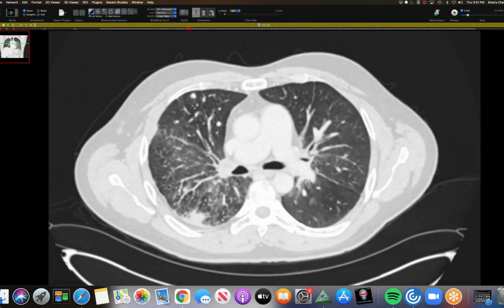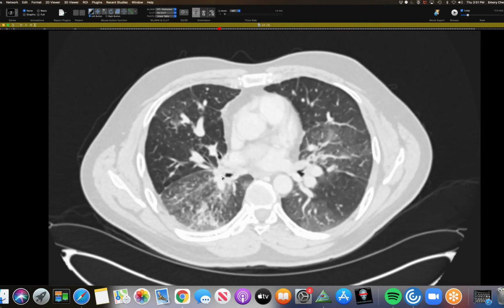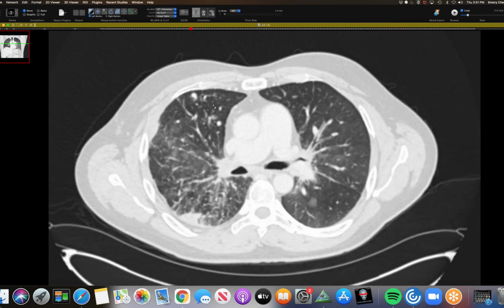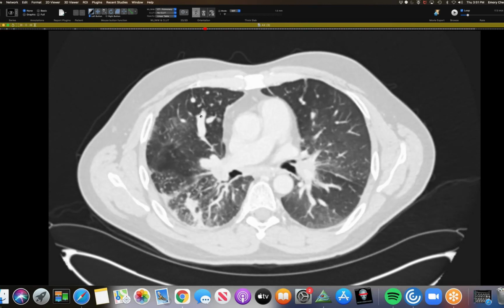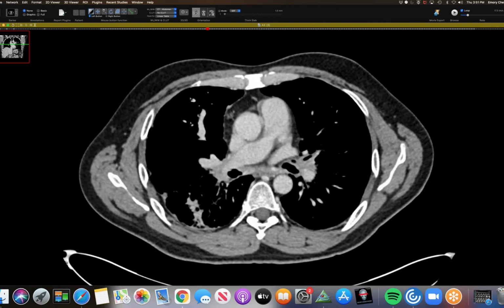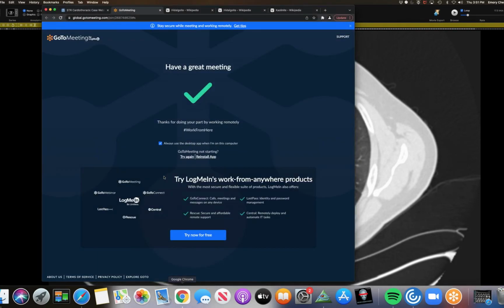The interesting thing is, with silicosis, some of this makes sense with the fibrosis. But I don't see nodules, and I haven't seen a whole lot of these types of varices that have formed here. They look like mimics of AVM. I recently looked at this.